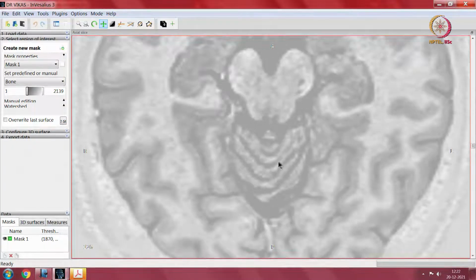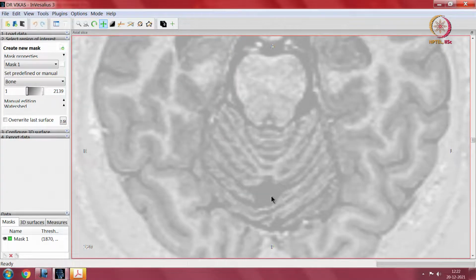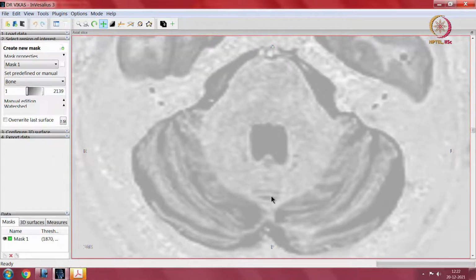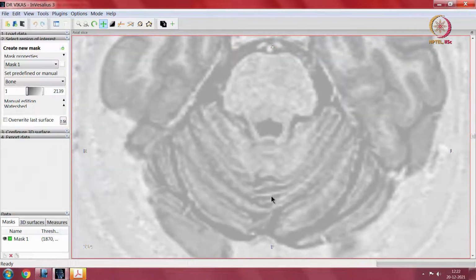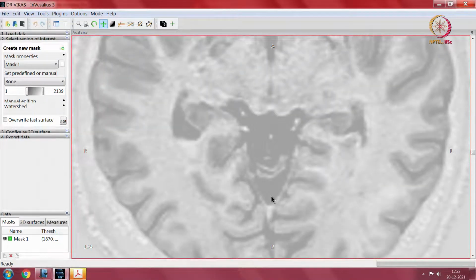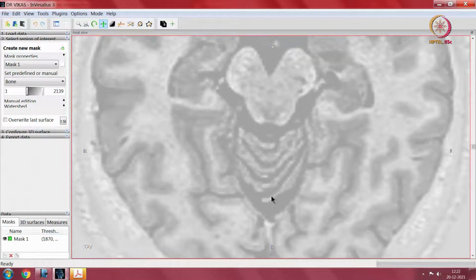Midbrain, still part of the cerebellum seen. This gap through which the brainstem and the cerebellum pass is called the tentorial incisura. So, opening in the tentorium, the tentorium in turn splits between the upper part, which is the cerebrum, and the lower part, which is the posterior fossa containing the cerebellar hemispheres.